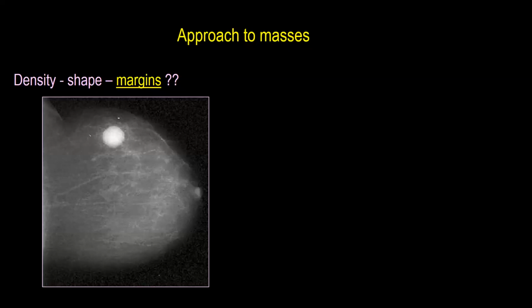If we find other ultrasound suspicious features, we might upgrade it to 5. And any mass with high density is BIRADS 4C. It should be. Being high density, it is BIRADS 4C. So this case was circumscribed medullary carcinoma. That was the diagnosis.